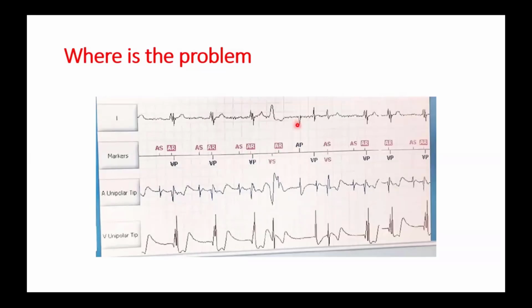So the atrial pacing, this atrial pacing is not followed by an atrial electrogram. So this is malcapture, or the threshold needs to be increased, from this paced beat in the atrium, which is not followed by an atrial electrogram. Look at the atrial channel. Look at this spike, not followed by an atrium electrogram, but this is ventricular paced.